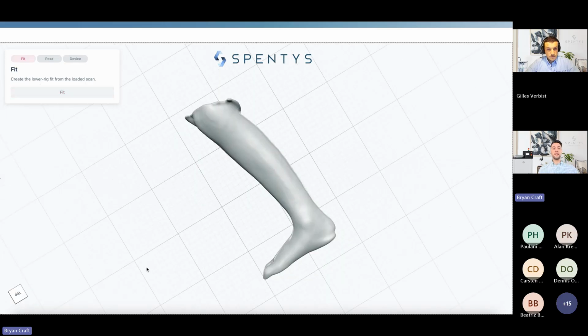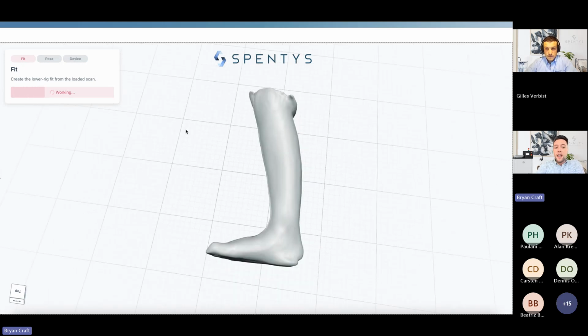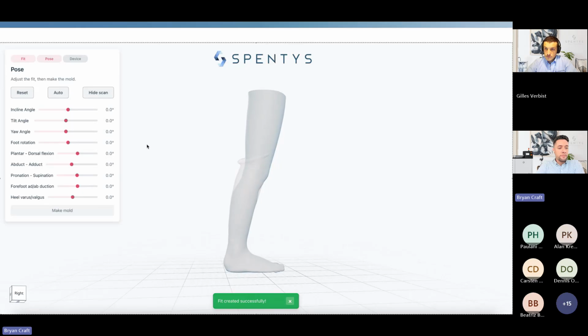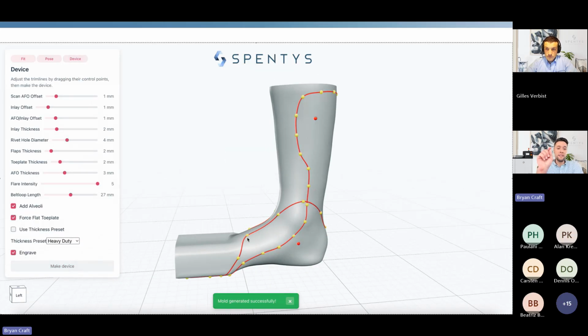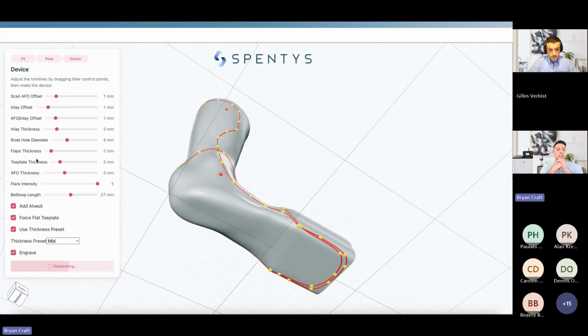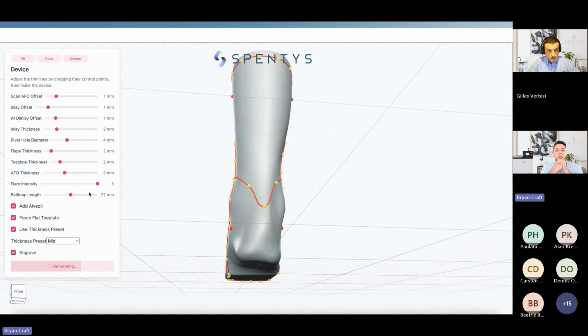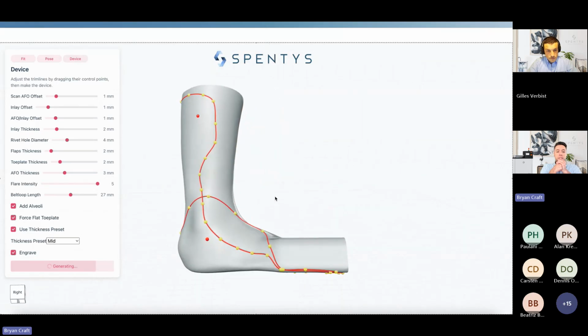It starts with this example that I'm sharing with you, which is a raw scan, and one that's not been modified. And we upload it to the engine. We've got many of the same tools and functions available to you in footForma, but what's really impressive here is we have automation to the max. I just pressed automate, and it's created my mold. It's created the trim lines for the solid ankle AFO and the molded inner boot, which I could go in and manipulate and change. Or on the left-hand side with my sliders, I could change the offset, which is the distance between the limb and the orthosis, thicknesses, profiles, things like that.